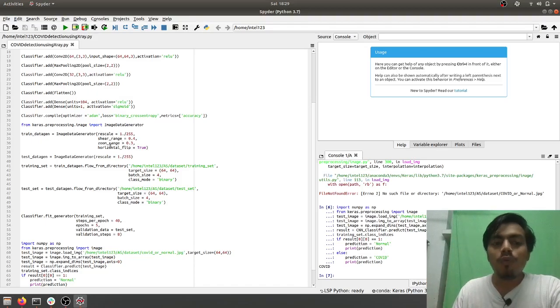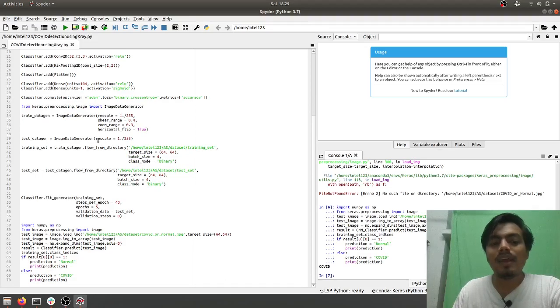With these different parameters, the number of images is augmented, and they are used in my training. Similarly we do it for our test also. In test I have just used a rescale of 1/255. I have not kept shear range, zoom and horizontal flip because we don't need that much augmentation for a test, we need more for train.